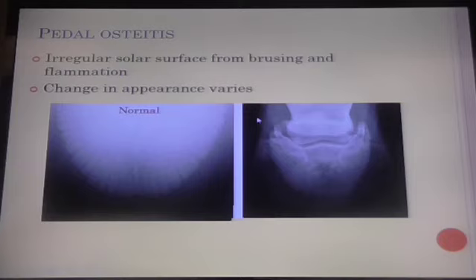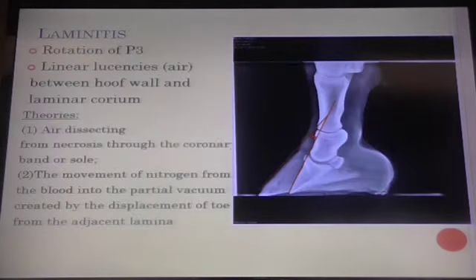So keep your eyes open. And just because you see the radiographic finding, does that mean the animal is exhibiting signs? If they're on a hard surface, you might see that and it might not be clinically significant. So all of that comes together with the clinical signs.